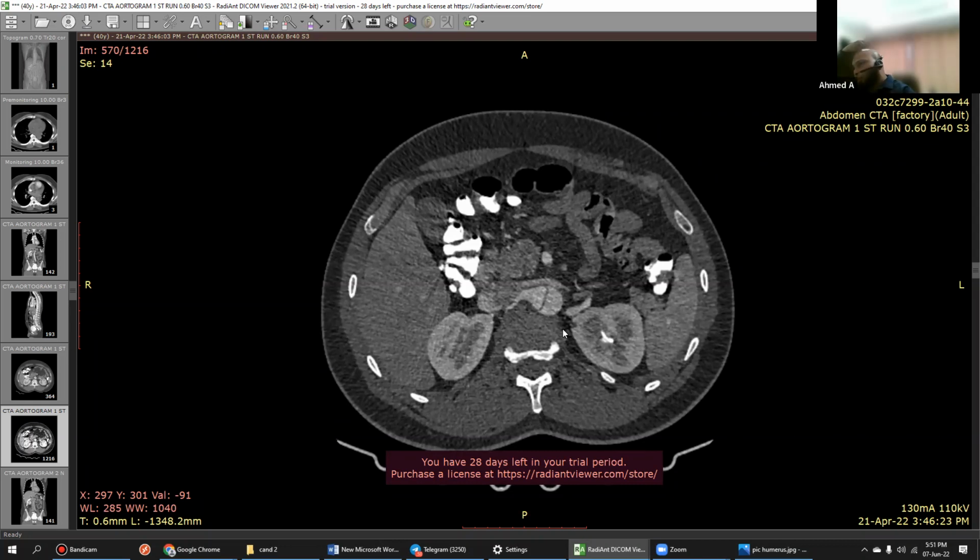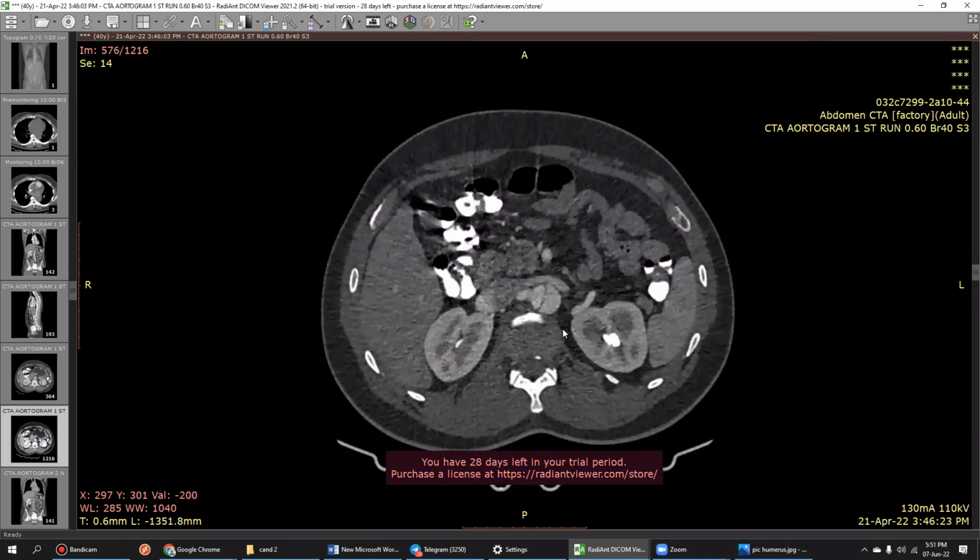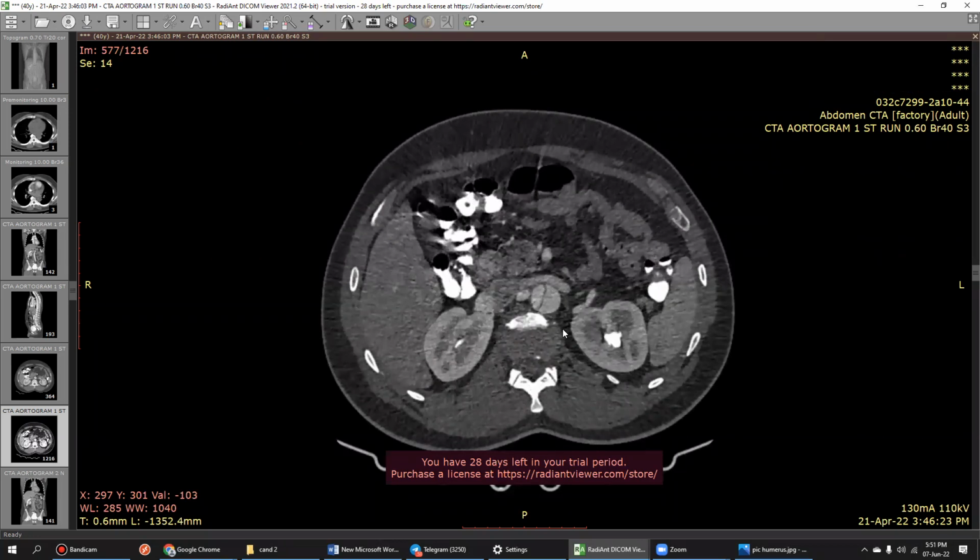So true and false you have told. What do you have to conclude the case? In my routine practice, I'll review the organs for any evidence of infarctions as well. So till now, I will conclude the case. This is an aortic dissection, Stanford type B, with extension.